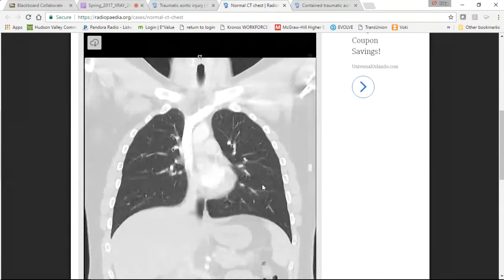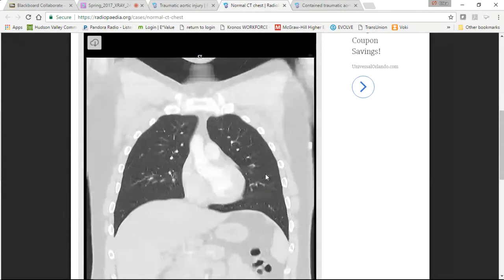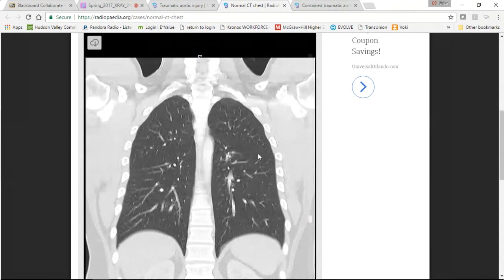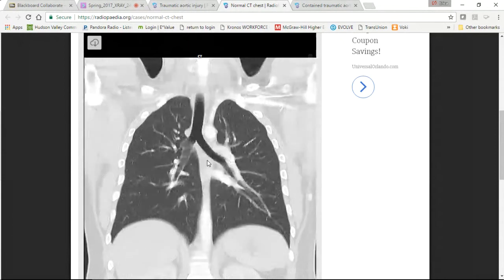It's not very clearly visualized, but you can kind of follow this. Where is it? You can kind of follow this. I'm seeing it anteriorly here, and it's kind of traveling up as I travel posterior through the lungs, but I'm not getting it on a good slice. Here's a bit of it right here. Okay, so there's your left oblique fissure, right?